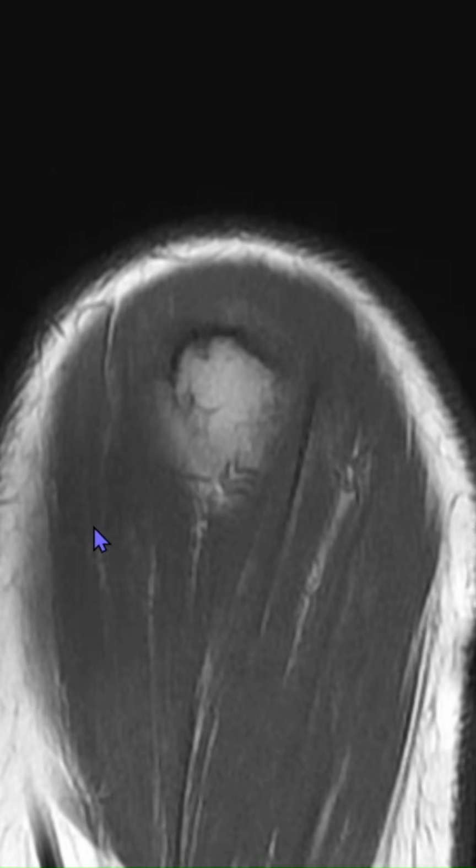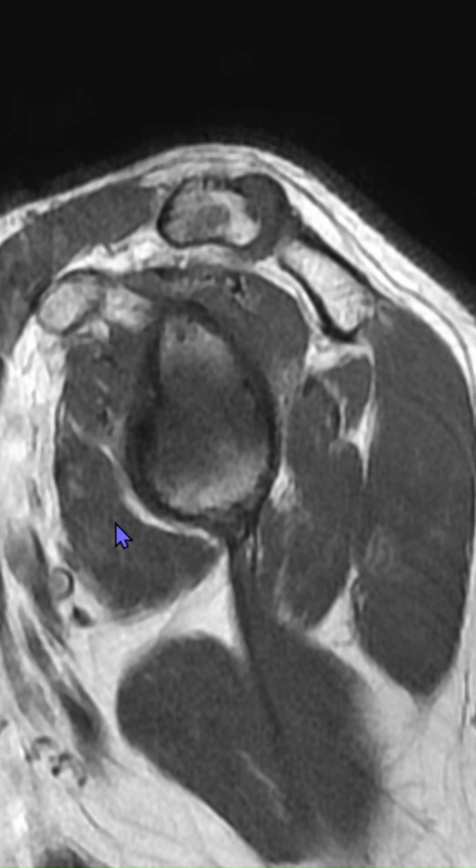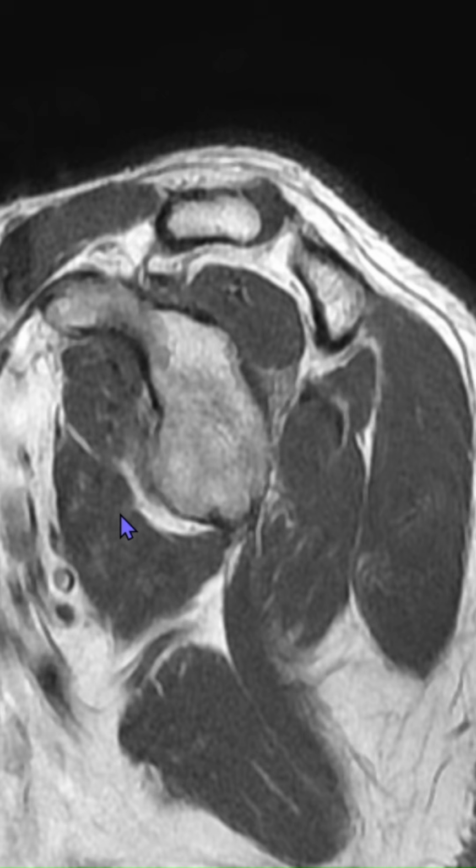So one more thing that we need to see is whether there is any fatty atrophy, because if there is any fat within, then also it will appear a bit like this. So on the T1 sagittal images, we see that there is no fatty atrophy within the muscle belly. So this would point towards a subacute denervation type of changes. So it could be representative of plexitis.